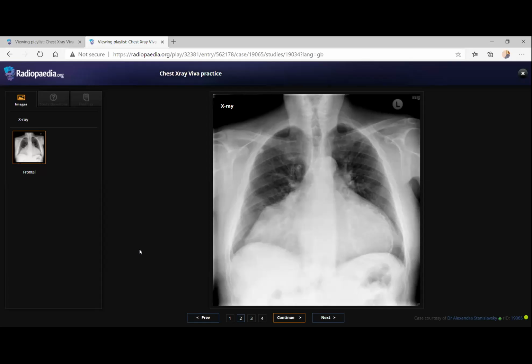I would like to compare this X-ray with any previous X-rays to check if this cardiomegaly is present. I would also like this patient to be referred for an echocardiography, given that I can see both lung fields. This patient is already in care of cardiothoracic surgeons and cardiologists. He's already in cardio. Okay. So I would discuss the case further with the clinician. He came for a routine checkup in the cardiology.